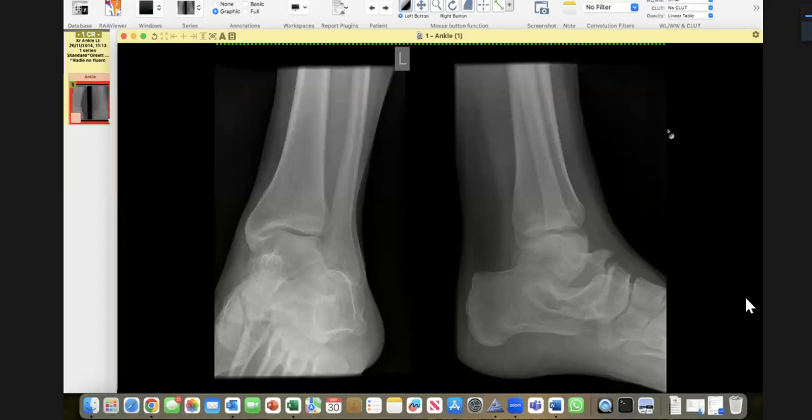Can you see the bony... Can I use the mouse control? Yes. Oh, okay. Yes. Now can you see that? Yes, sir, this is a bony projection that is arising from the talus. Are you moving your mouse? I wanted you to point out the finding you are referring to. Yes, I'm moving my mouse. Can you see my mouse?